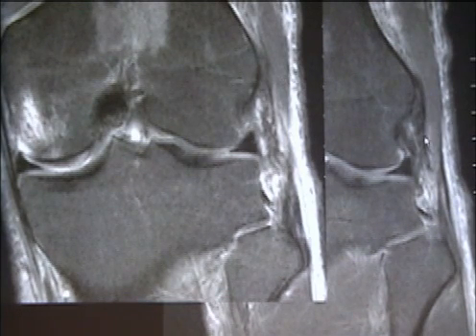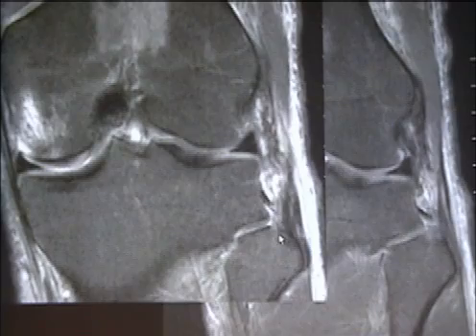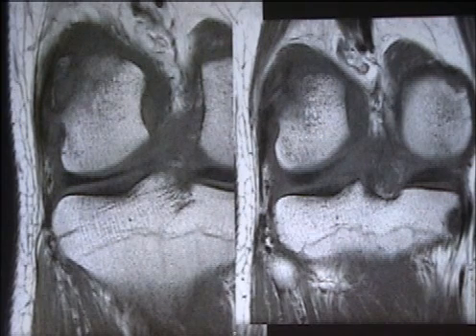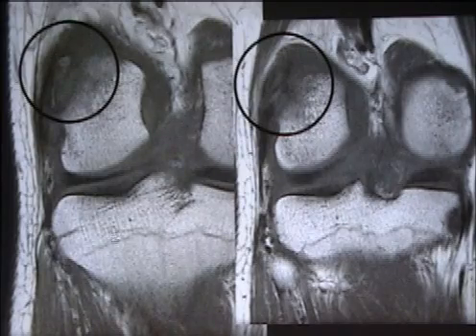Here's a fibular collateral ligament. The biceps is intact, but the FCL is disrupted. This is all the torn, retracted fibers from back here and over here. So a little bit of a different variation on the same theme. You trace your ligaments down here, they look okay. But if you look up proximally, relatively uncommon proximal avulsion of the fibular collateral ligament.